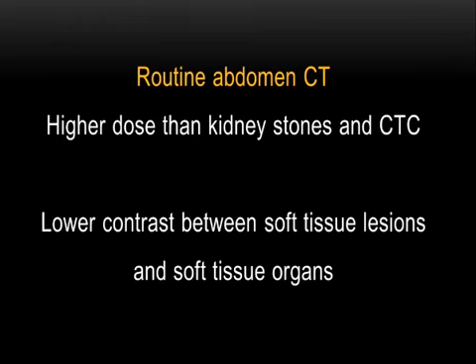So, how about the routine abdominal CT? Well, it certainly does need higher dose than CT colonography and kidney stones. It also needs higher dose as compared to your routine chest, because you're looking for low contrast things that can be small, that can have very little difference from the background, and therefore you need higher dose.